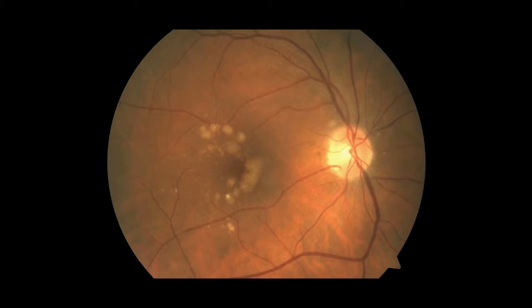Today we are talking pigment epithelial detachments, or PEDs. This is a very common referral into my retina practice, so I wanted to share with you two cases. The first case is a 74-year-old woman who presented with this type of appearance that you can see here, a lot of drusen on the image. Let's take a look at how that appears on the OCT.